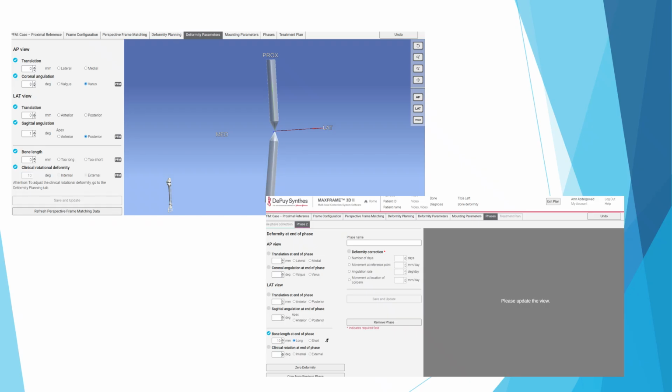One thing that I'd like to mention here is very important. Before, when we had the old programs for the TSF, adding shortening or lengthening was very complicated. We used to put grids and see how we were going to extend two points together, the origin and corresponding, which are now the proximal and distal.